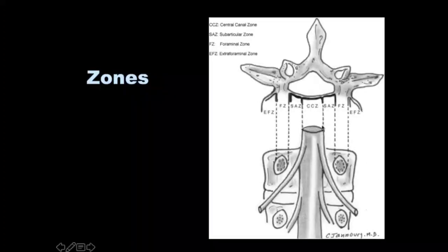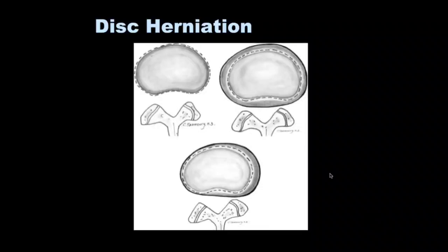So whether this is a traversing nerve, where it's sort of traversing and then it exits over here. Up till over in that region, it'll be the traversing nerve, and when it goes into the neural foramina and beyond, it is the exiting nerve. So that's something to bear in mind when you're putting the report up.